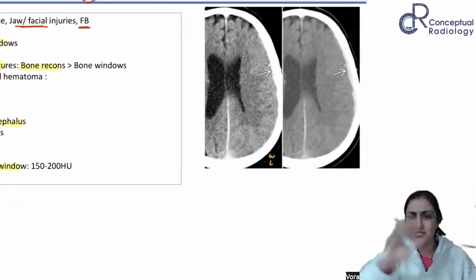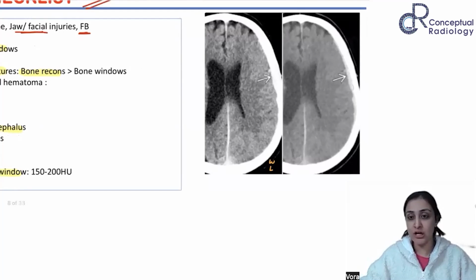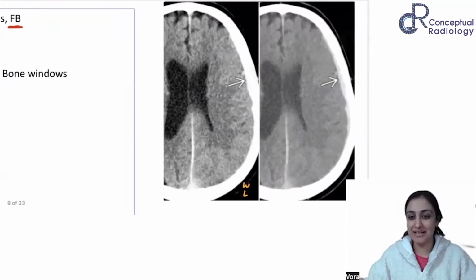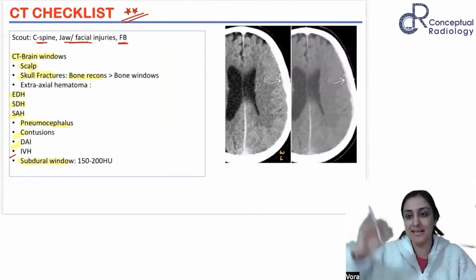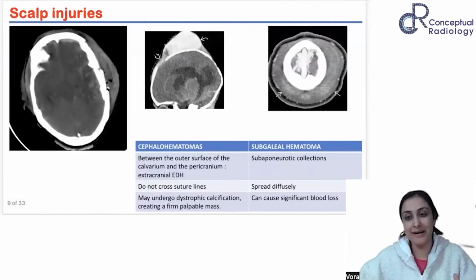If you are reporting CT, just try out the different window and levels, and spread it out to become a wider window. I'll explain all of these terms as we go along. Experiment such that the image looks a bit blurred, a wider window. I don't know how to translate wider window for you, but that is what you try and achieve. Just play with the windowing a bit, and you would be able to see the image better, and you learn with time what a wider window means.